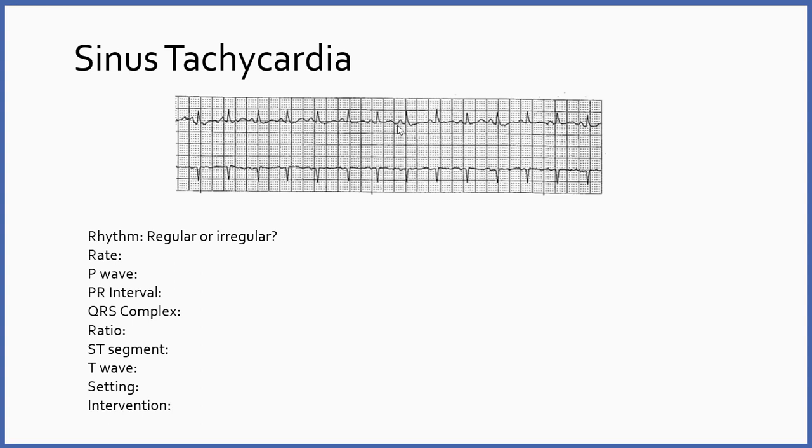All right, so remember you measured the PR interval from the beginning of the P wave to the beginning of the QRS. So for example, in this one, I would have measured from here to here. And you'll notice that it looks like it covers about 3.5 baby boxes. If you got somewhere between 3 to 4 baby boxes, you're fine. So if you got something between 0.12 to 0.16 seconds, that's fine. We have a normal PR interval.